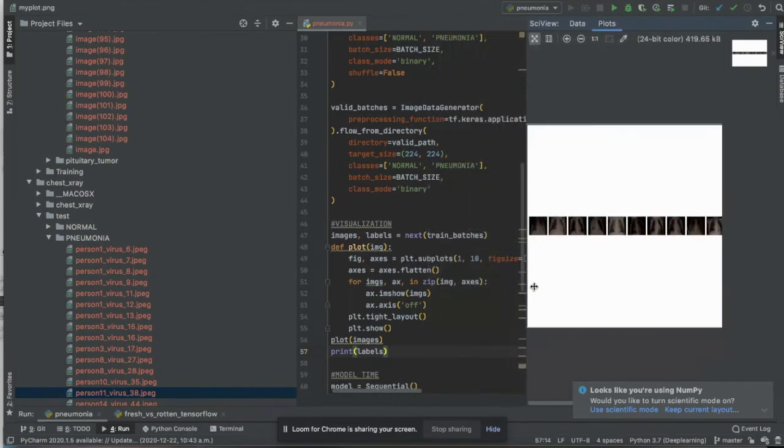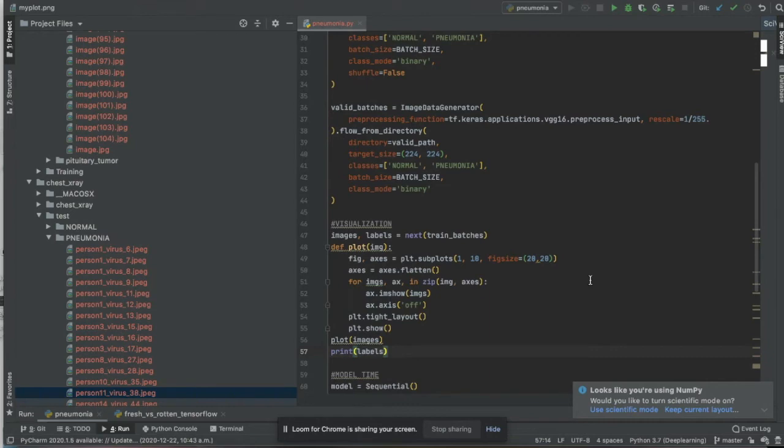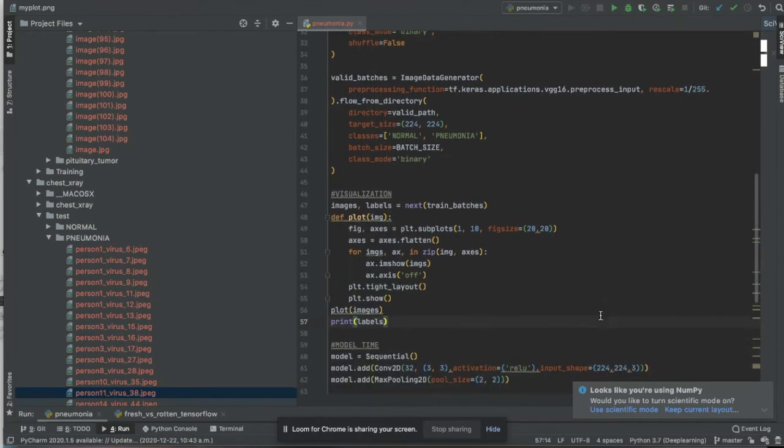It's really important to rescale your images in this project because I didn't the first time, and I actually burnt the lungs. I'll insert a picture. It was really scary, but it's very important to rescale your images.